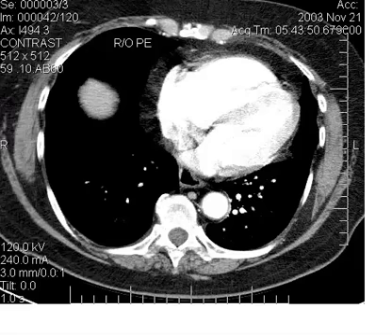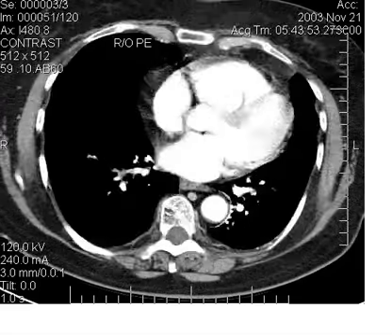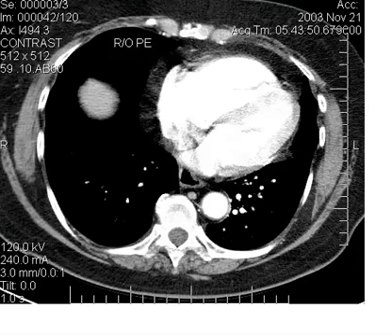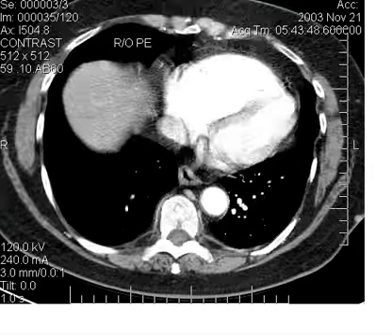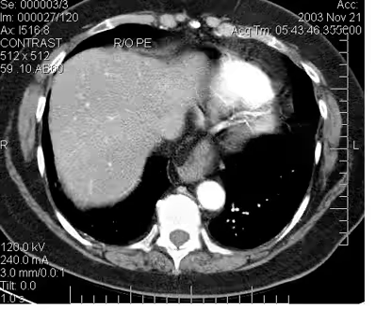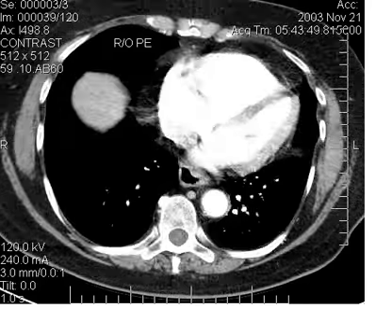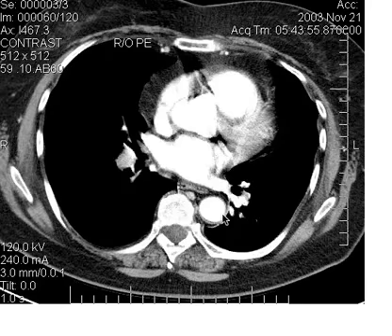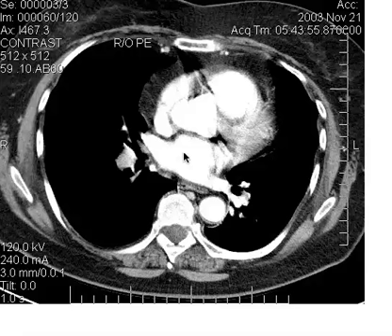The one caution I would suggest, though, is when you see a vessel here that you think has a clot, make sure it's not a pulmonary vein, because pulmonary veins have extremely variable opacification on these studies. The way you find out is you follow it back and see if it's going back into the left atrium, as oxygenated blood will. So these are all pulmonary venous branches.